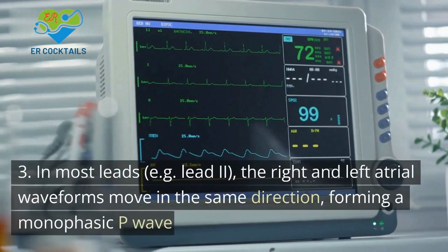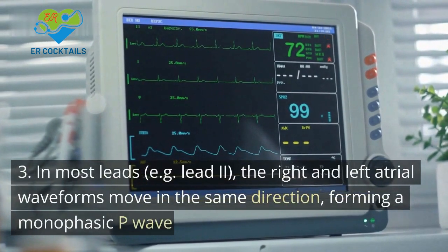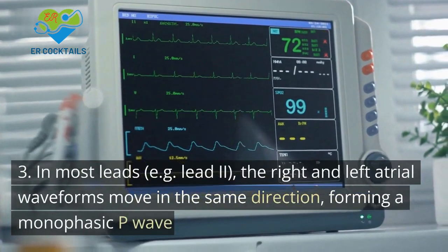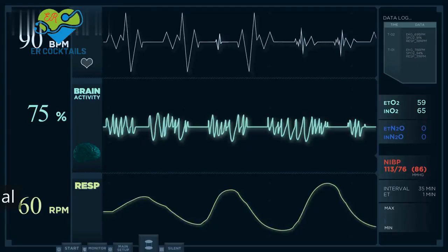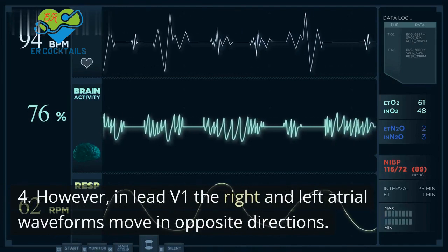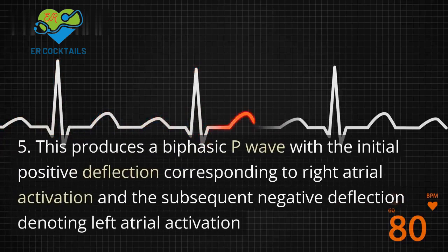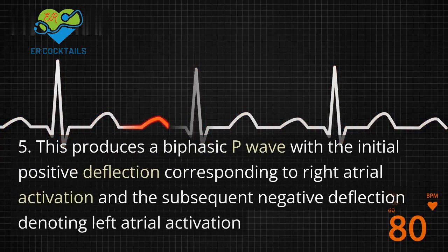3. In most leads, e.g. lead 2, the right and left atrial waveforms move in the same direction, forming a monophasic P wave. 4. However, in lead V1 the right and left atrial waveforms move in opposite directions. 5. This produces a biphasic P wave with the initial positive deflection corresponding to right atrial activation and the subsequent negative deflection denoting left atrial activation.